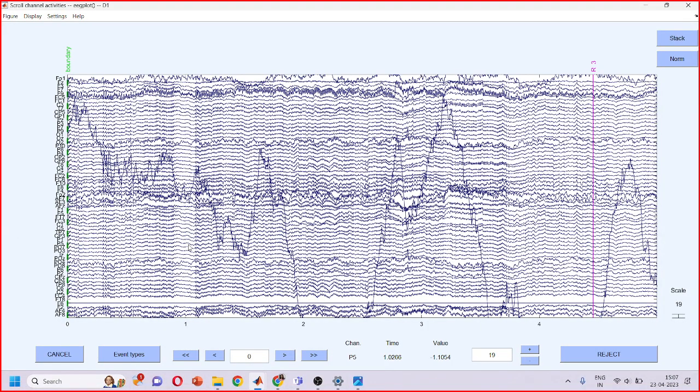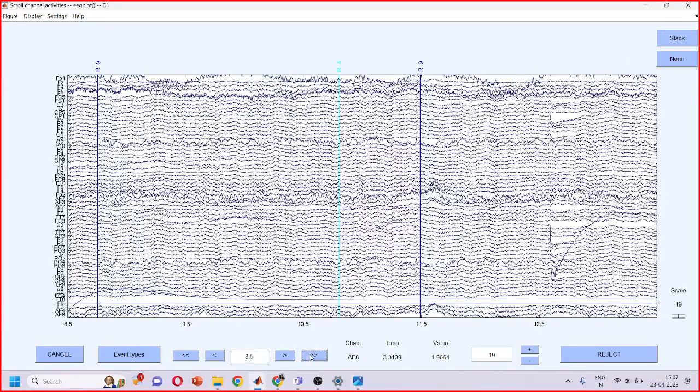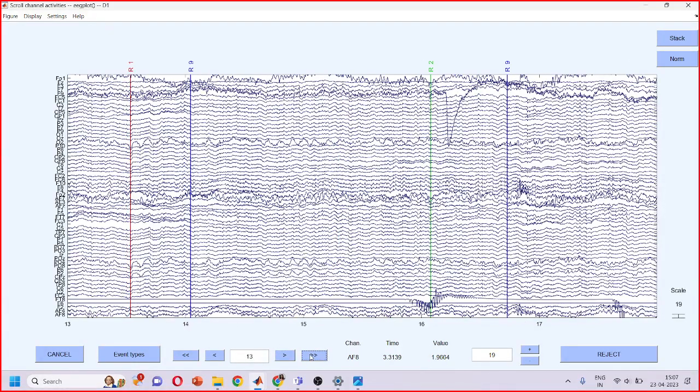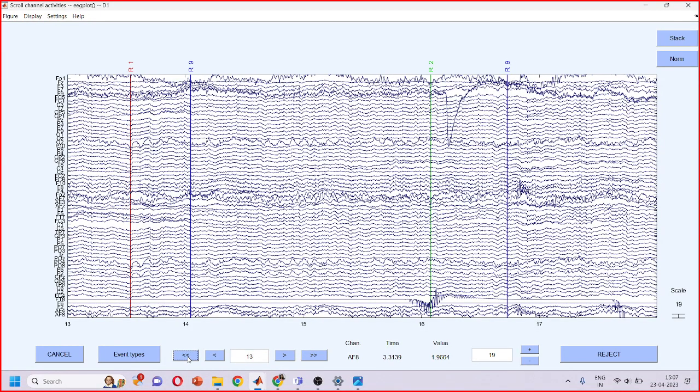This is the real data, and this very bad signal comes from a mastoid channel, which is FT8, and we can actually remove that later. But this is a nice way to just preview the whole data first. So I'll be skipping the segments. The data otherwise looks very clean, as in it has very nice wavy structure.